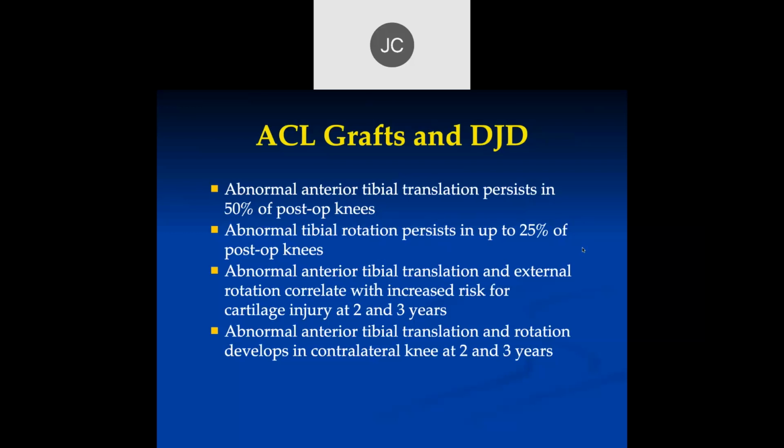Now, the rotation tends to occur if the femoral graft is too high up. If it's near the 12 o'clock position, then it no longer stabilizes against rotation because it's right in the rotation plane, so you tend to get a lot of rotation. So the positioning in the coronal plane of the femoral tunnel should be around the 10:30 to 11 o'clock position, and that will help decrease the risk for rotational instability.